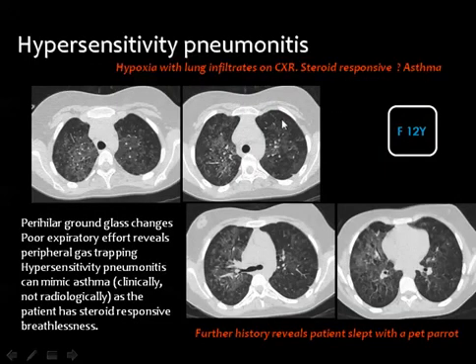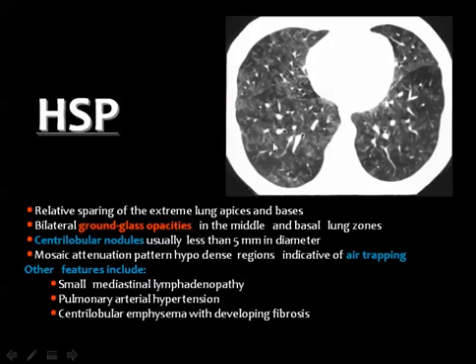And if you look here, you have ground glass opacities, and in an enlarged picture you can see these opacities are intermingled with areas of more translucency. This is the clear lung, and this is the ground glass appearance. If this appearance is a chronic presentation, then you put hypersensitivity pneumonitis at the top of the differential diagnosis. One may ask why I do not consider this usual interstitial pneumonia: because of the absence of traction bronchiectasis and the absence of honeycombing. Why don't I consider this non-specific interstitial pneumonia? Because there is no traction bronchiectasis. Okay, you know what I mean?